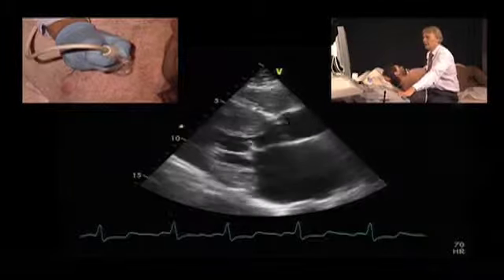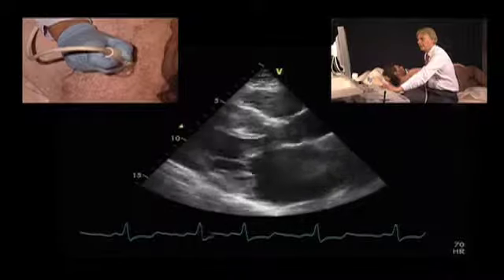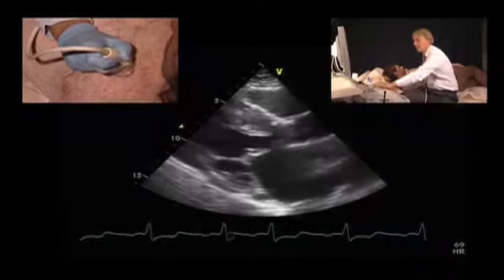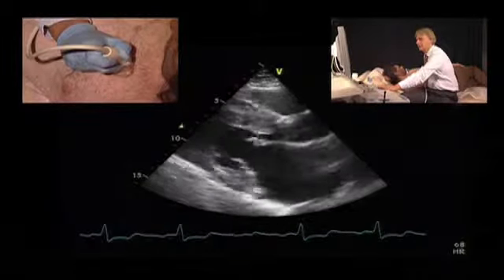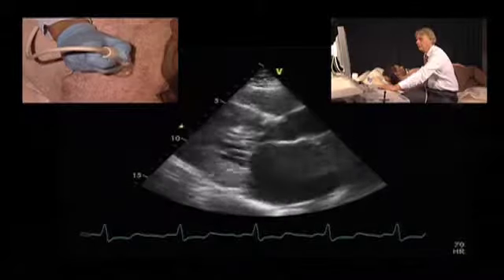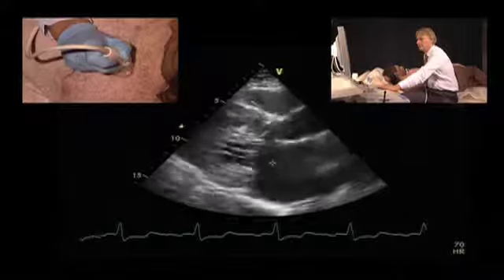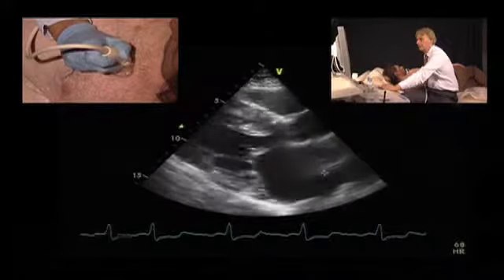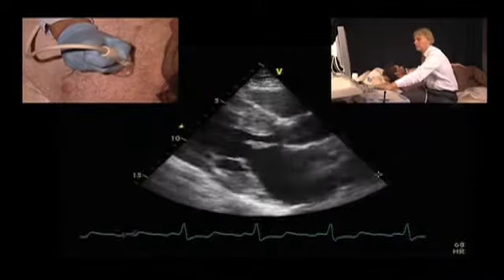obstructive cardiomyopathy. There's a number of other findings we can see. First of all, we have a fairly speckled appearance of the interventricular septum. We also have a thickened endocardium here in the region of the LVOT due to the turbulent flow, and also a thickened anterior mitral leaflet. It's also apparent that the patient has an enlarged left atrium and good systolic function.